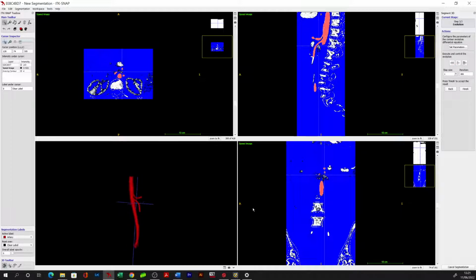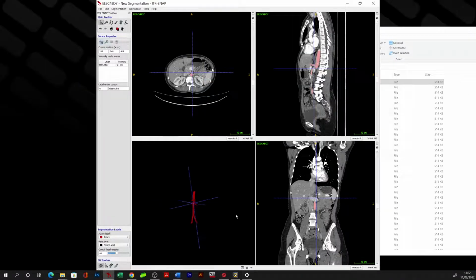so that's probably as good as we're going to get. But I think using this approach is going to be certainly quicker if you can achieve it, and the results are going to be better from an aesthetic point of view, because you don't get as severe stepping artifact between each slice, because the computer is probably better at overlapping those edges. So you can see that the result from this is smoother in comparison to, say, the previous case where we went through.